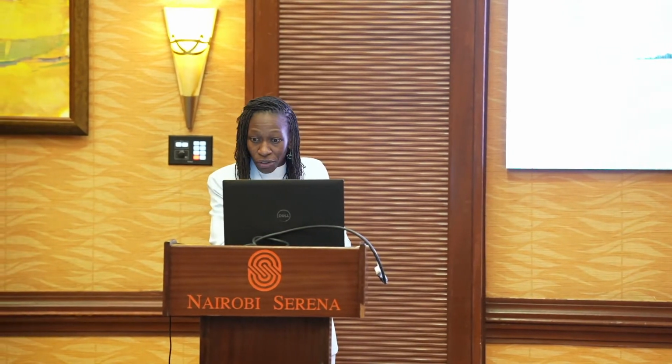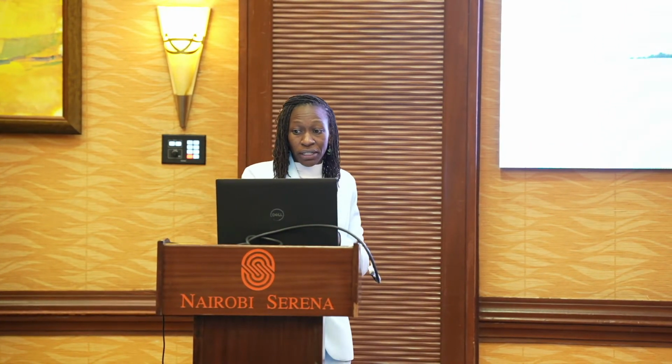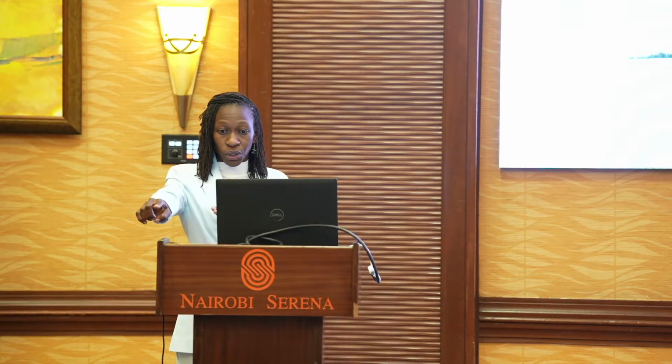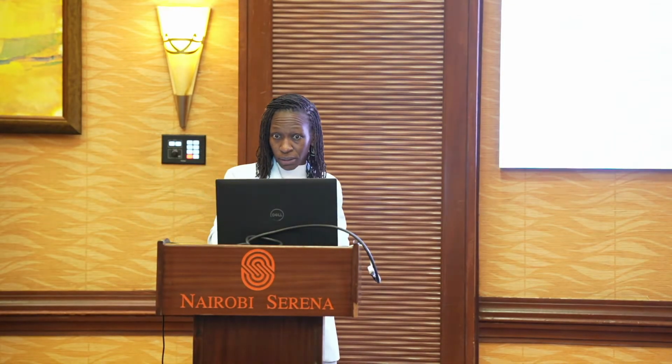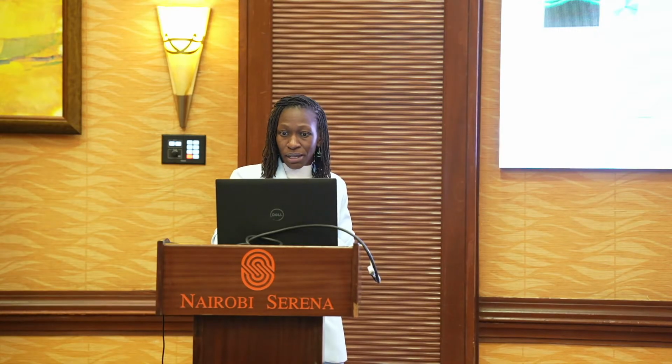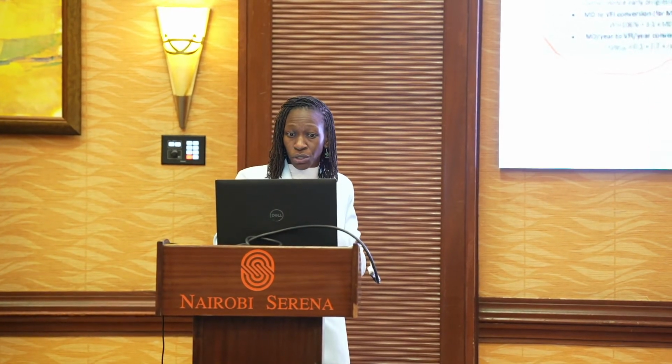This is helpful now for this. You see, like this mean deviation. So if this patient today is 2.2, and next time they come at 4.5, that is more than 2, okay? So that's a patient you should either repeat the test, to make sure they're not progressing. So that's the cutoff. Rapid progression, 2.2.